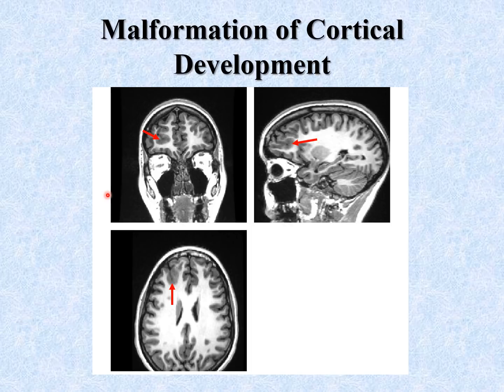You may also use the MRI to assess abnormalities in cortical development. In this individual, we see gray matter in a location that we should normally see white matter. We see it on this sagittal section and we see it on this axial section. This should be all white matter in this subcortical region. Instead, there's a large area of maldeveloped cortical tissue in the white matter.